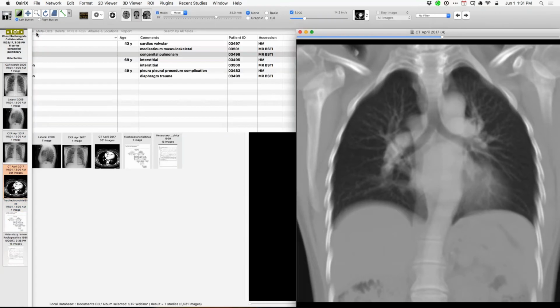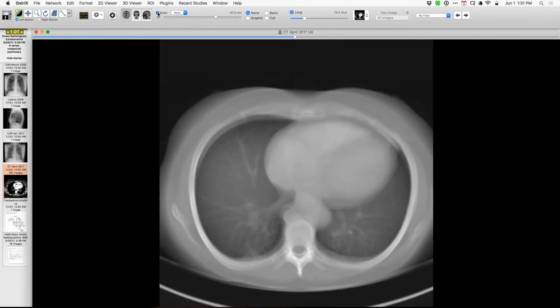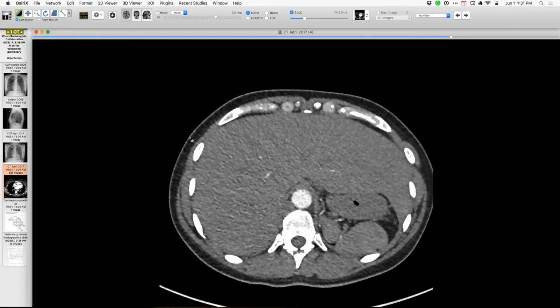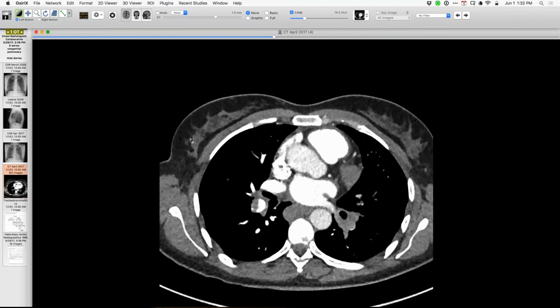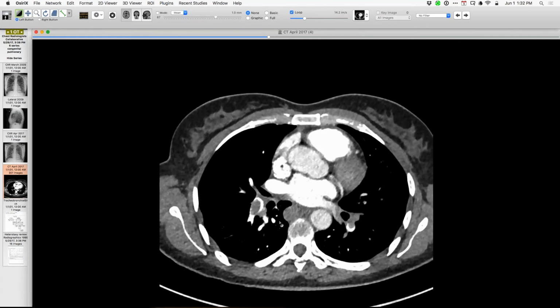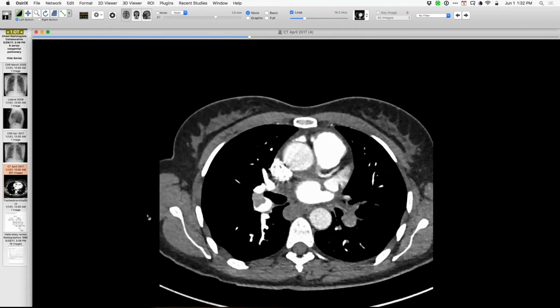And that's tracheobronchial. So now I will take this away from the coronal here and go back to the other to show you that, yes, we have azygos continuation of the IVC. We have polysplenia. So that fits really nicely. So we have the tracheobronchial situs abnormality and the associated polysplenia. Azygos continuation of the IVC is present. And this, you can see, was just all clarified in the context of a study for PE. So a really nice example of that imaging finding.